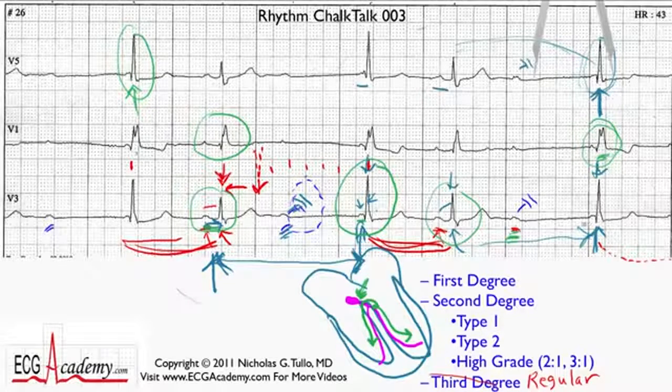It's pretty complicated, but I hope you'll at least take away some important lessons in how to approach this kind of very complicated ECG and how ECG experts will use the physiology to figure out exactly what's going on.